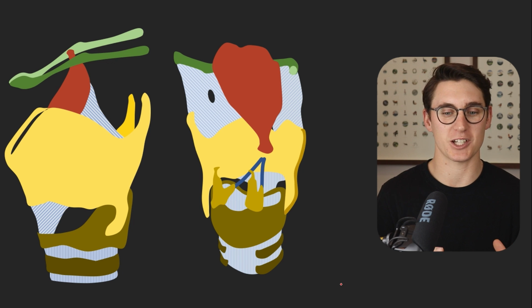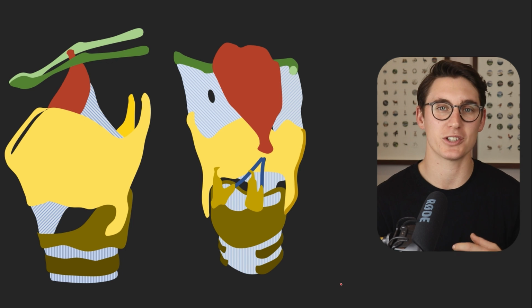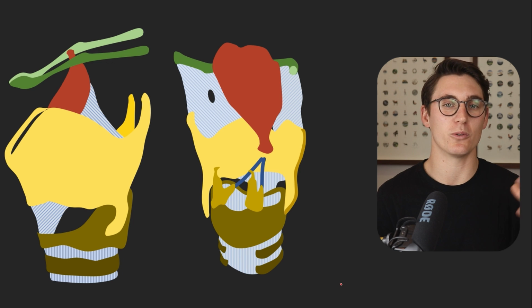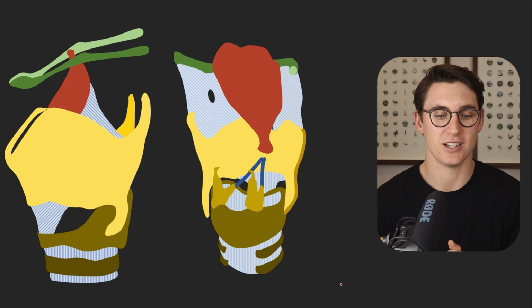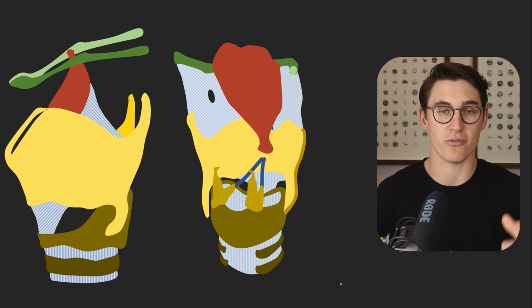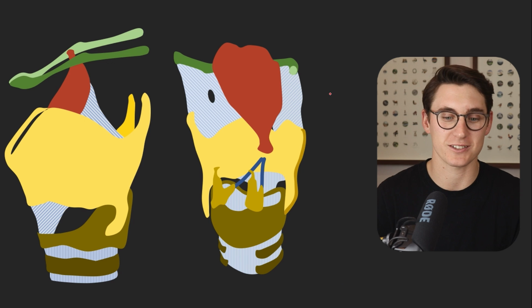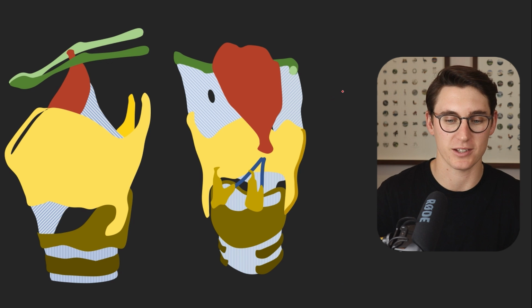Now today's focus is going to be mainly on the major components of the larynx and the components that we need in order to stage laryngeal cancers. There are lots of smaller components that I will look at in another video, especially the intrinsic and extrinsic muscles of the larynx. So let's start by having a look at the cartilaginous and bony structures that make up the exterior shell of the larynx and provide the larynx with its anatomical structure. And it's these various components that we're going to be trying to look for on our CT in order to figure out where the different components are in relationship to one another.